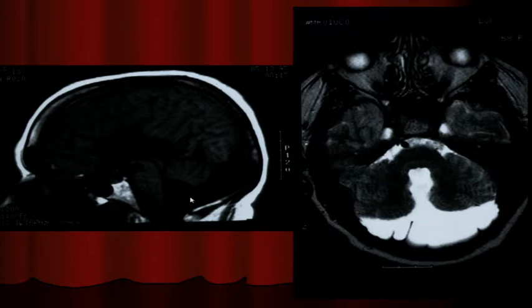Dandy Walker is the worst. Then you have the Dandy Walker variant, and then you have the megacisterna magna, and everything is good. It's just below the vermis of the cerebellum; the cisterna magna is a little bit prominent. So it's megacisterna magna, the variant, and then full-blown Dandy Walker. In the variant, you'll have partial agenesis or partial dysplasia of the lower half of the vermis, so that the fourth ventricle does go into this posterior fossa cyst.